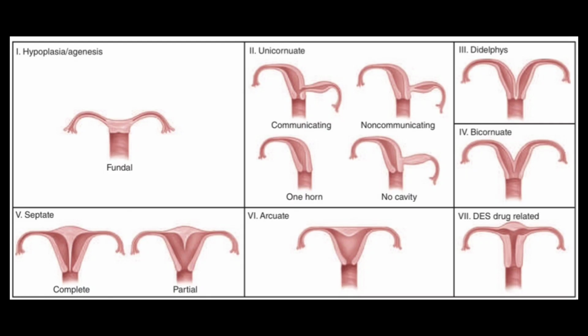Image number 7, I'm not going to explain, because it is a bit confusing and I do not want it to confuse you. I have arranged some of the pictures, some of the images. Hopefully these next slides will show you certain images. These are MRI images and these are ultrasound images, which will help you to identify to some extent these congenital anomalies on ultrasound imaging.